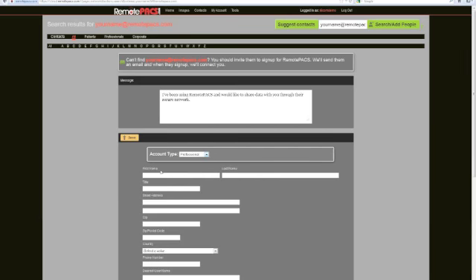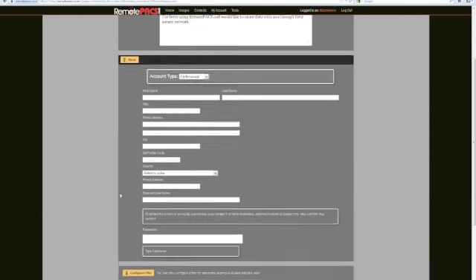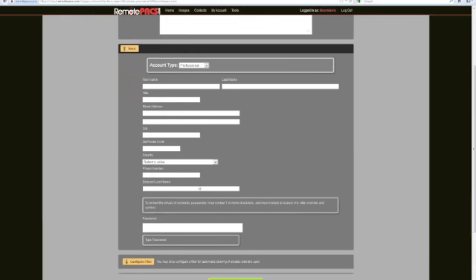You can go here and select professional. We'll put in their contact information, first name, last name, address. More importantly, we need to pick a username for them. So we'll just put in a username, and we'll also put in a password. Just so you know, all passwords need to have at least one number, one letter, one symbol, and they need to be at least 7 characters long.